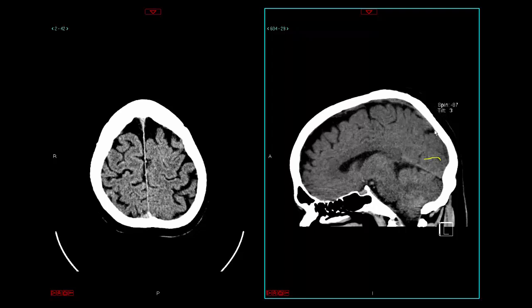Remember, this is the parieto-occipital sulcus, the marginal extension of the cingulate sulcus here, and then the central sulcus here. They have a term for this. This is called the precuneus here, the parieto-occipital sulcus here, and the cuneus here. So again, cuneus, this is the occipital cortex, precuneus in your parietal cortex. Calcarine sulcus here, this is sort of the lingual gyrus of the occipital cortex, sitting underneath the calcarine sulcus. This being your tentorium here, just to give you some bearings there.